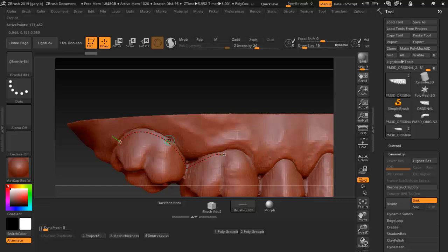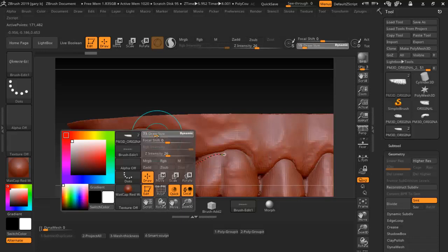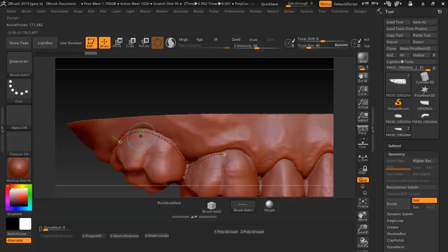And you can adjust your cursor when it's blue. And then you can move these guides where you want them to go. Alright. Need to move them up a little bit further. This is kind of moving them. Now, like I said, you'll get these little kinks as you go around. Don't worry about it till you get all the way to the end.